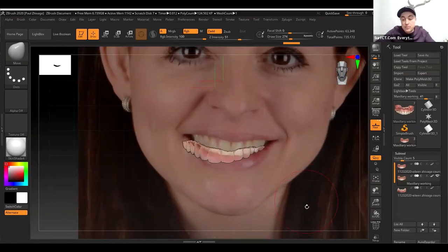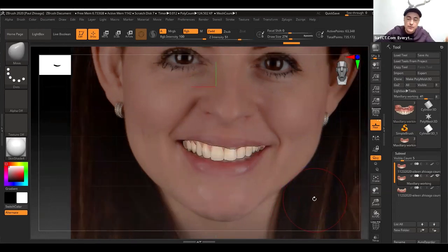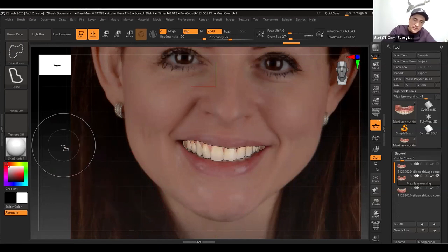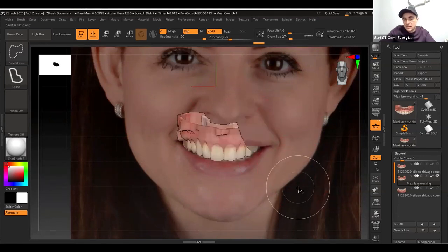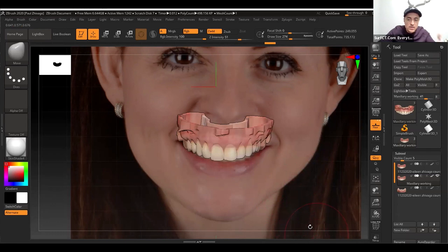So for putting it back into the default position, I push shift and move, and it will fall exactly back into that position. Now, again, if I push control and shift, I have the lasso back, and if I click outside, it will just give me back that part that I removed. So this is not really removing anything. It's just visually removing certain things. Okay, so you're not losing the file. It's just like make it look as if it would be there.